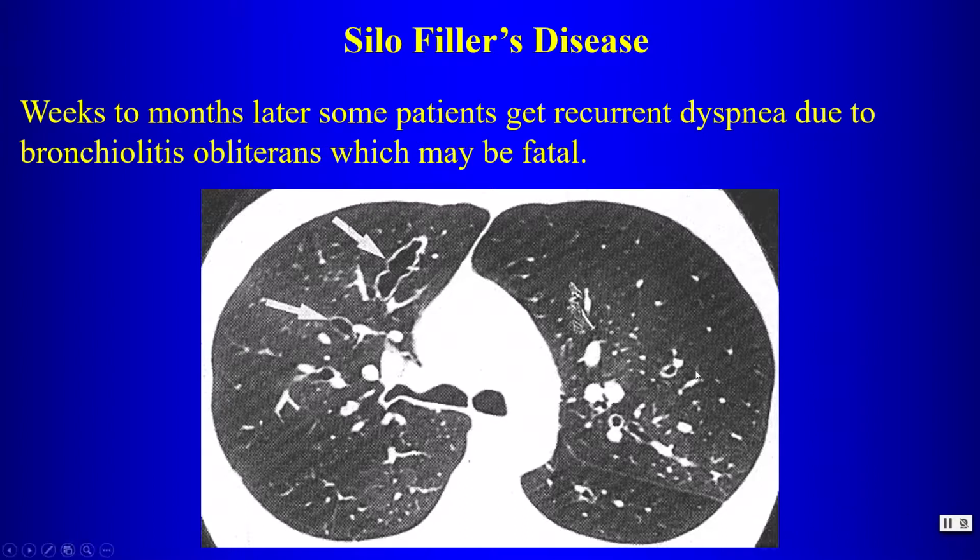So you'll see air trapping here as a result of the damage to the small airways, and here we have a little bit of bronchiectasis involving airways because of damage.